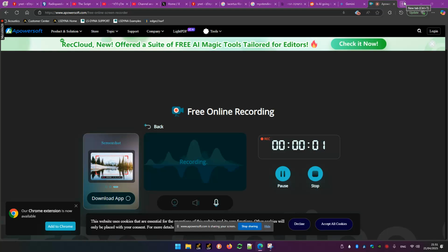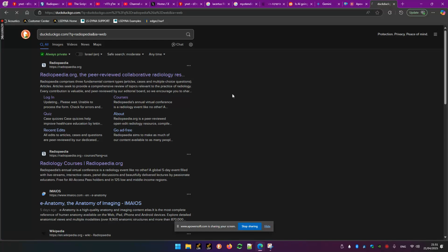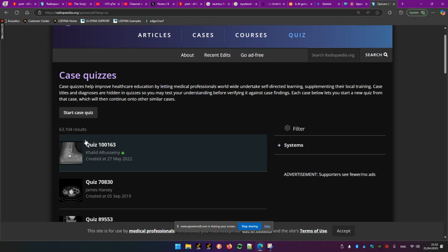Okay, so let's get to the case of the day. Let's go to Radiopaedia and let's do some quiz. I'm not sure what is going to happen, but let's start a quiz. So let's start it.